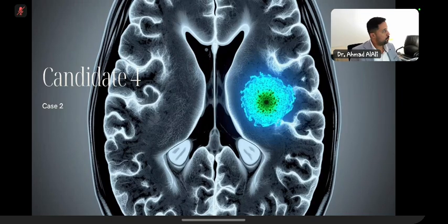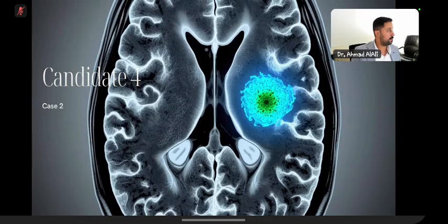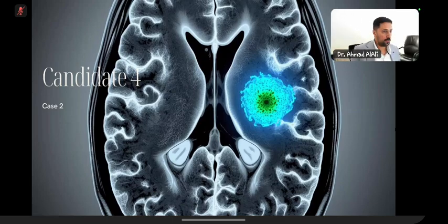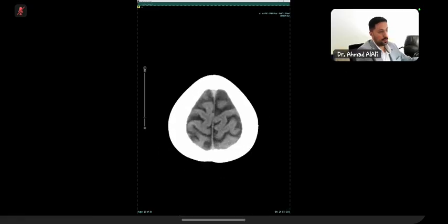It will take just a second to upload. Please bear with me. So, you can see the brain CT scan images, right? Sir, not able to see the CT slices. Just a second. Okay, now you can, right? Yes. Okay, please go through them and tell me your findings.